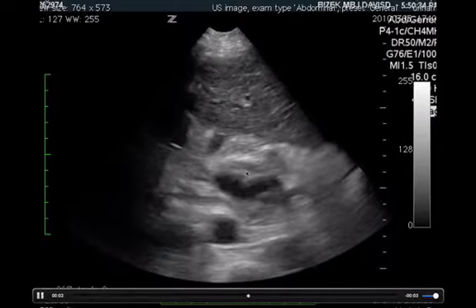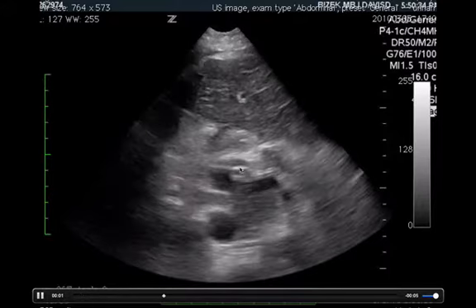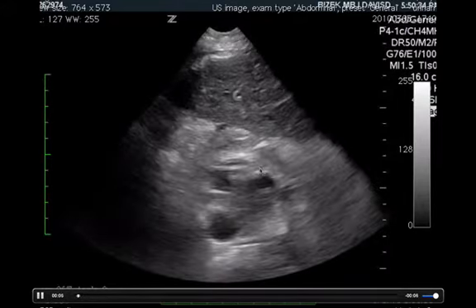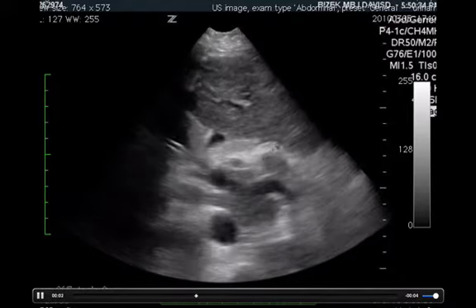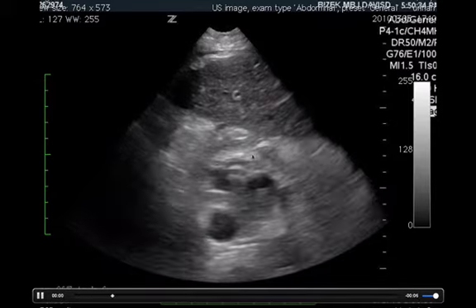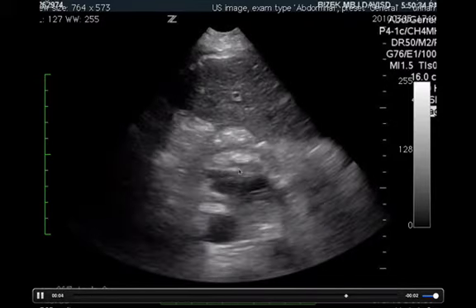This is another example of the celiac artery, and this time the celiac branches are very tiny here and you can barely see it. So you can see, just like everything else in the anatomy, some celiac arteries are very small and others are quite ample.